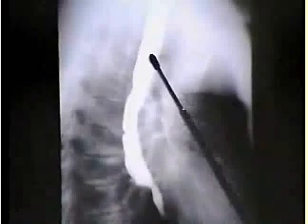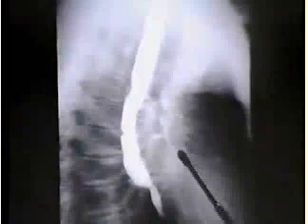The lateral film from the esophagram makes that quite clear. Instead of flowing smoothly downwards, the esophagus is displaced. Notice that displacement by a subcarinal mass is more cephalic than displacement by an enlarged left atrium, which would be at this level.